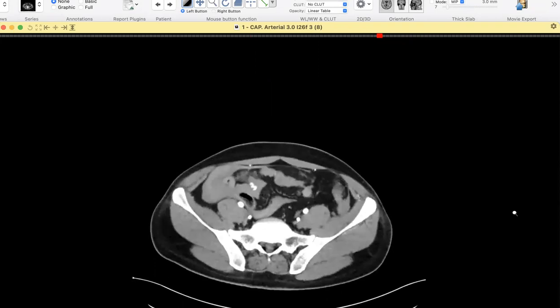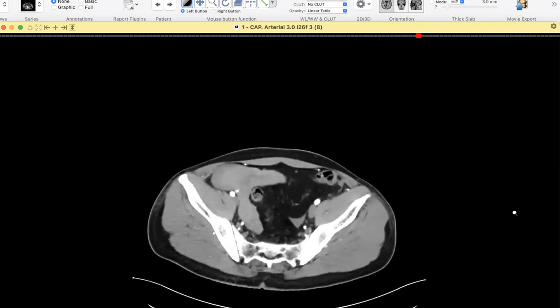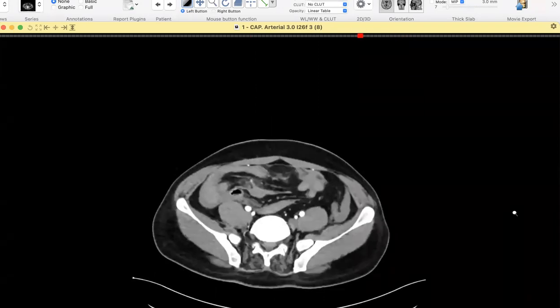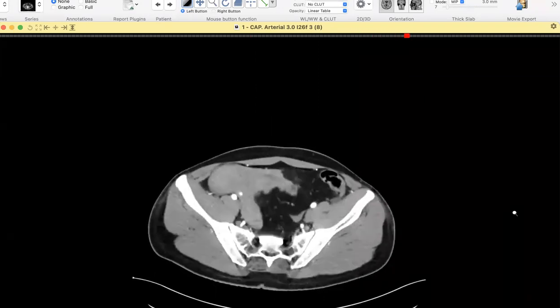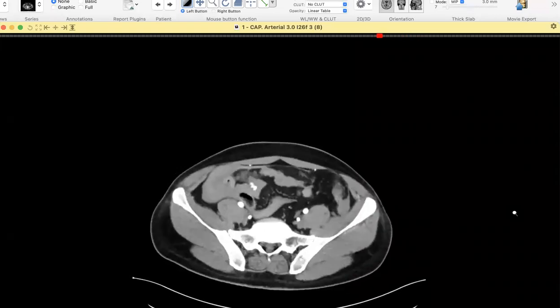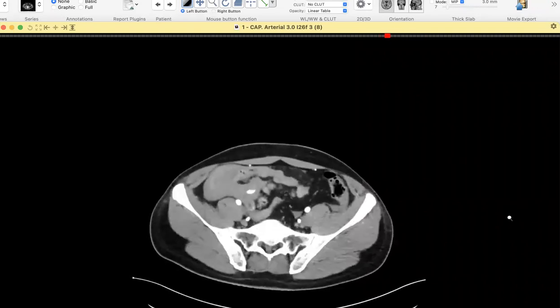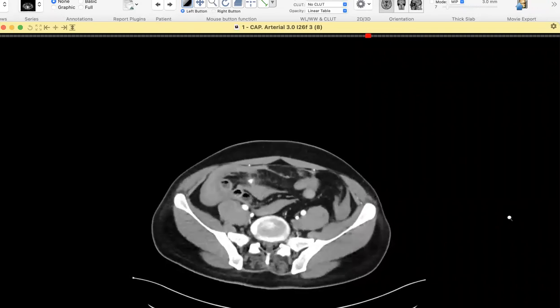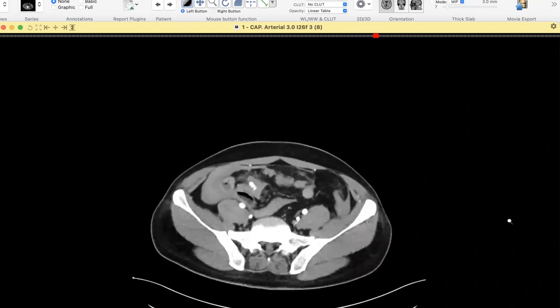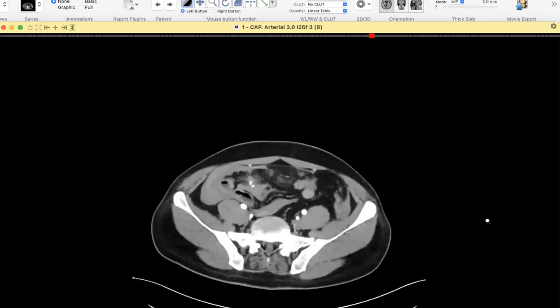So this external iliac artery, probably there's some contrast extravasating from this space into the peritoneum, and probably this is the cause of acute hemorrhage and destabilization of the patient. There is active extravasation of blood going on at this place. I'll convey my findings to the reference physician in order to refer the case to the interventional radiologist to control the space.